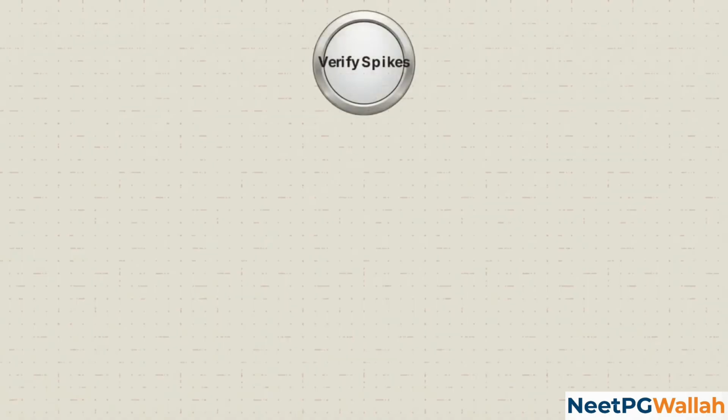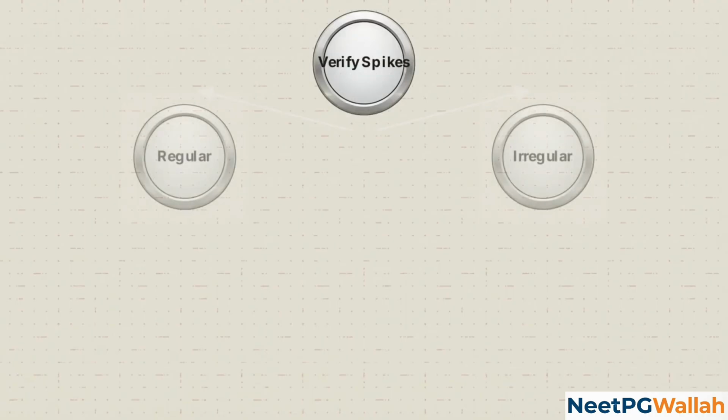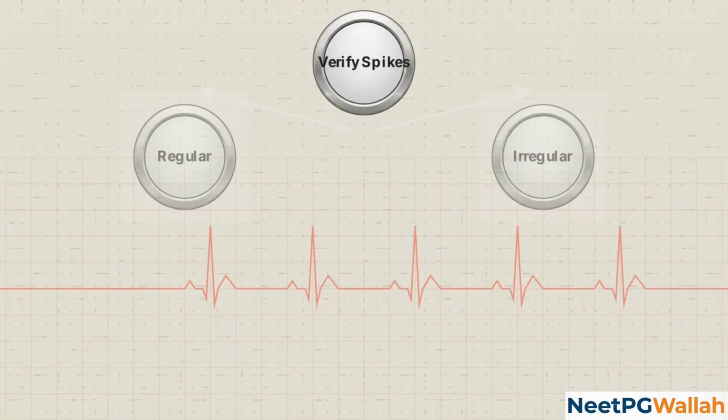To navigate these intervals accurately, clinicians use a specific decision tree. This mental map ensures that the correct mathematical formula is applied to each patient's unique rhythm. The first step is to verify the distance between the spikes. If the physical gap between every beat is identical, the rhythm is predictable, and we move down the regular branch of the tree.